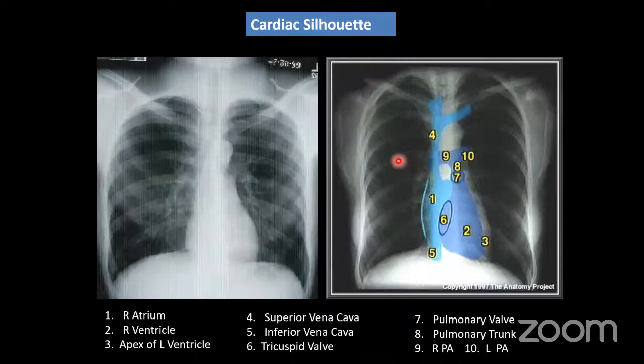I think you must have got bored listening to so much pulmonary pathology and boundaries. So let me go to the cardiac X-rays also. Already you know what the boundaries are. This is formed by the right atrium, because the right ventricle never forms the boundary of the heart. It remains here only. This is the right ventricle, and from here this is the superior vena cava, and this is the right atrium. Here there is the aortic knuckle, then the pulmonary conus, and the left ventricle.